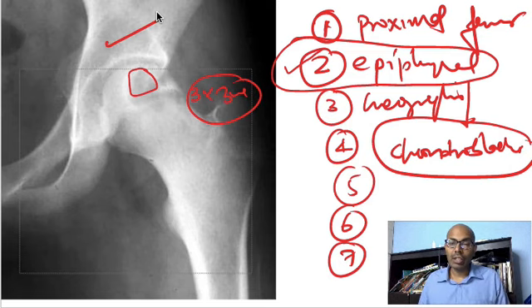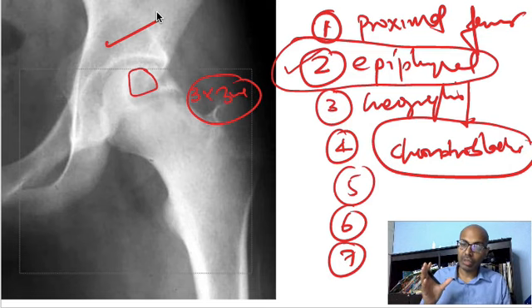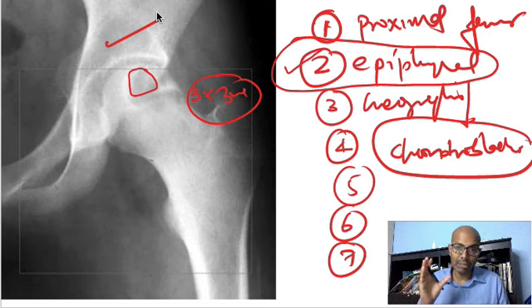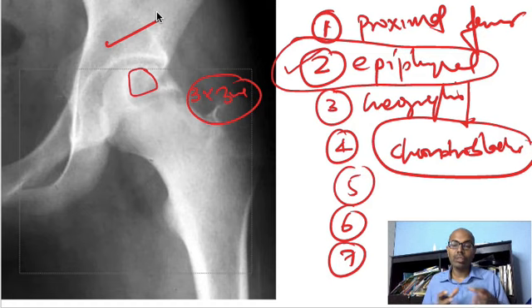So every X-ray doesn't have to be a spotter. You can take a look at all these parameters and make sure that you are heading in the right direction and you don't make any mistakes. So an MCQ has multiple options. You can easily pick one of these options, if you have confirmed by looking at these parameters.